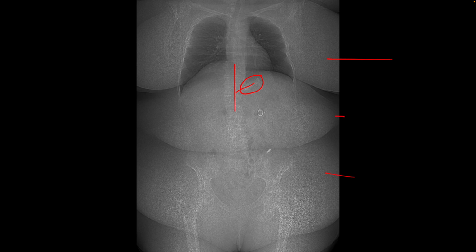They still are obese. The lap band is connected via a catheter to this subcutaneous port, and through this port saline can be injected to make this tighter around the stomach, or saline can be aspirated to make it loose or slightly looser around the stomach.